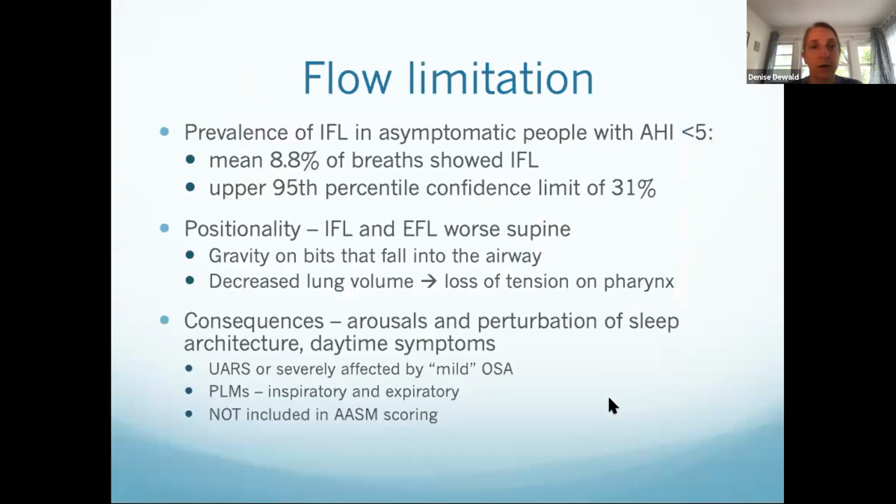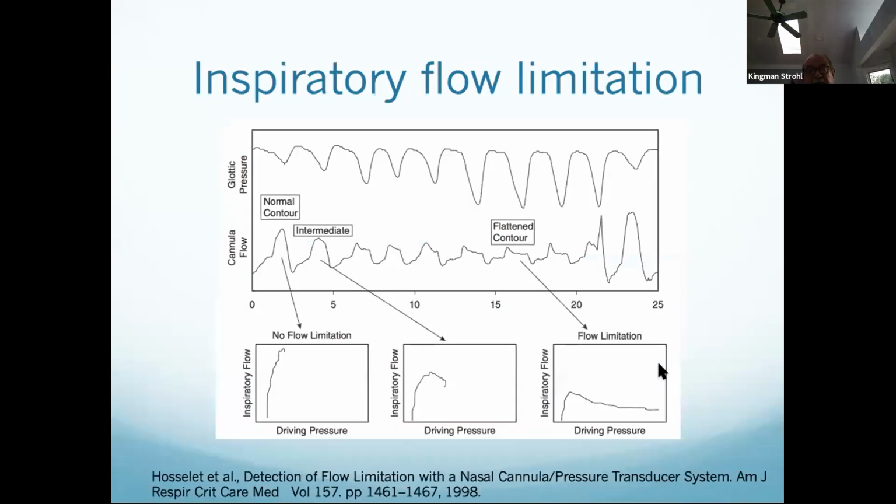Okay, so go back again. Sure. This is really important because you see this all the time. And so what you don't see is the glottic pressure, right? You don't have that on your thing. So glottic pressure is like esophageal pressure. And if anything, this pressure has to be below the level of the obstruction.